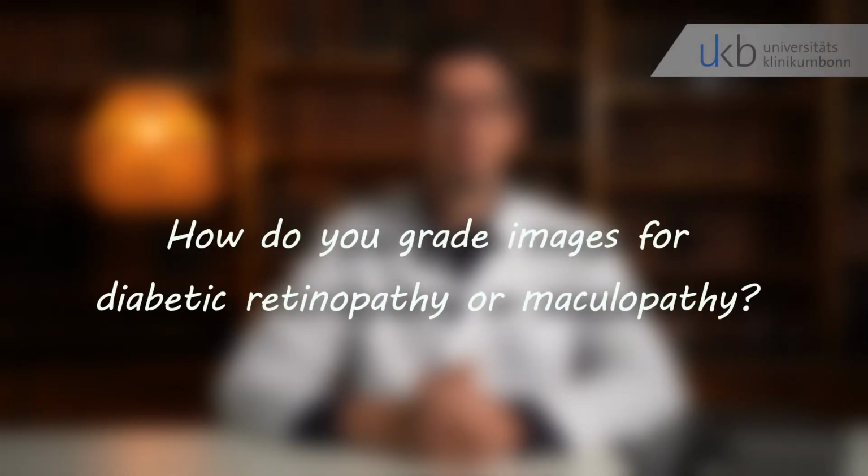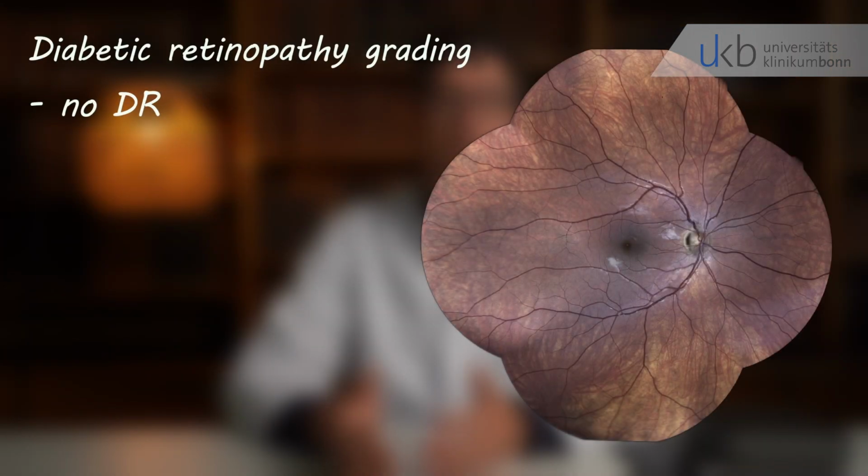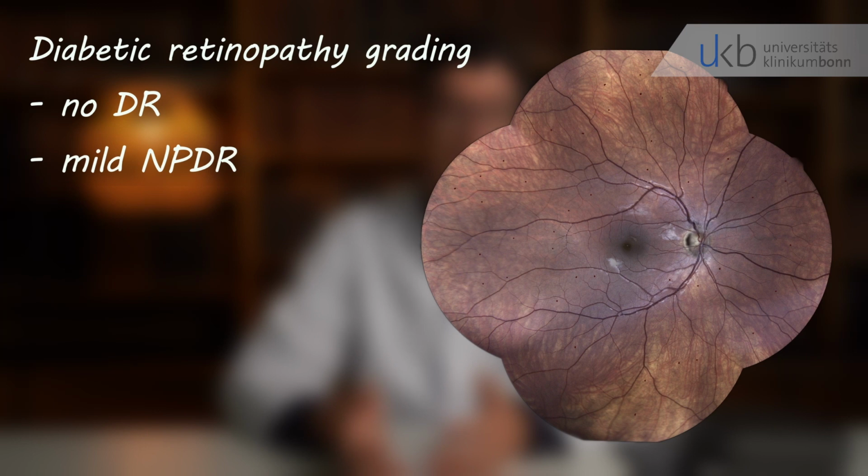How do you grade images for diabetic retinopathy and maculopathy? There are 4 grades for diabetic retinopathy. If you do not see any abnormalities, there is no apparent diabetic retinopathy. If you only see microaneurysms, it is a mild, non-proliferative diabetic retinopathy, abbreviated NPDR.